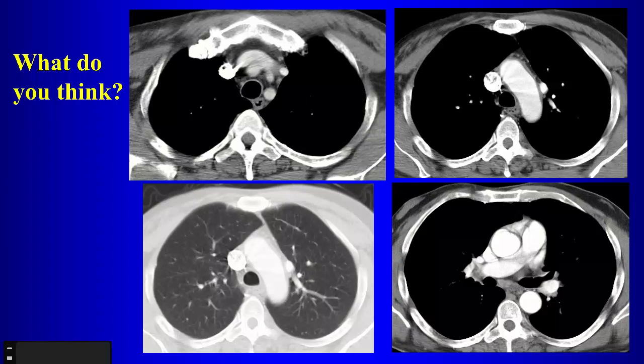What is this? Which is this? Yeah, it's connected. You can see the connection here to the pulmonary vein here, so that helps. That makes it easy. Partial anomalous pulmonary venous return. And here, you don't see the vessel anymore. You don't see the abnormal vessel here. This guy here, what is this guy here?